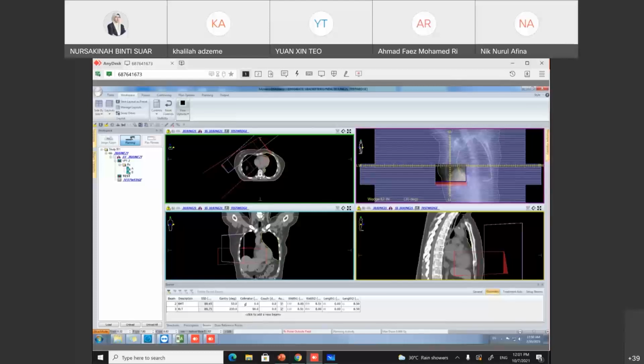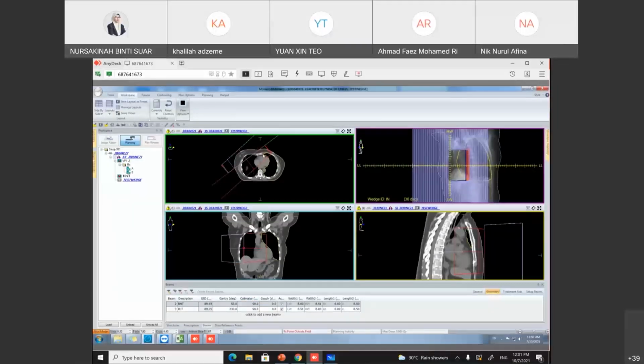So when I turn my collimator, if I turn 90-degree, the thick end will be the opposite way. So we need to know. It's okay if when you first join as a physicist you do not know the collimator angle. You will just play around with the angle. It must be 90-degree or 270-degree.